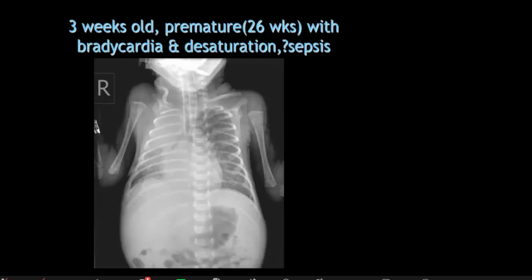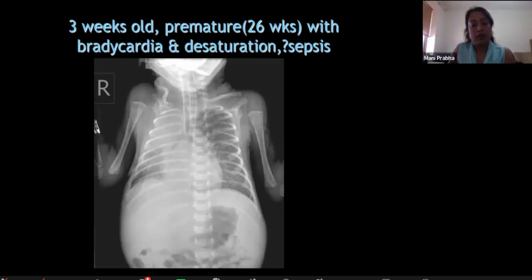The main thing I can see is the endotracheal tube is lower down, and as the baby's neck is flexed, it should be less than 3 centimeters, but it is more than 5 centimeters in the flexed position. So definitely it's in the wrong position, malposition. So it should be repositioned, and it should be informed to the clinical team, as it is obstructing the right upper lobe bronchus. Wonderful. Yeah, it is obstructing indeed, and it should be pulled up.